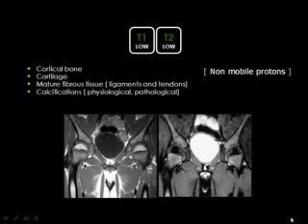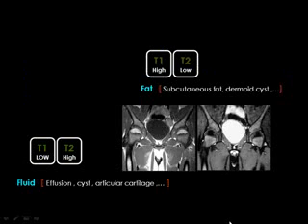Then a few words about the common appearances in MRI. What are the structures that appear low signal in the T1 and low signal in the T2? They are fixed structures containing non-mobile protons, including the cortex of the bone, the mature fibrous tissue, and the calcification. And add to this, in particular for the hip, the acetabular labrum.